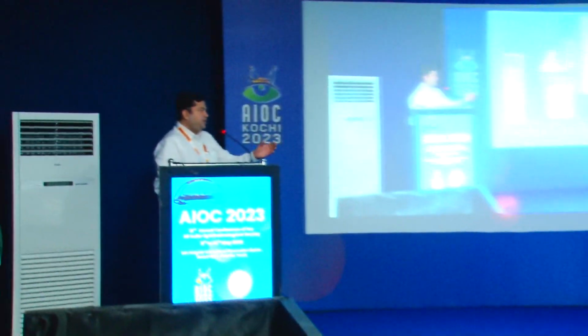For a non-vascular SHRM, it is important to identify whether it is a fibrosis, an exudate, a vitelliform lesion, or hemorrhage. This is based on the OCT, but the clinical scenario also matters, and the past history of the patient, like what Dr. Mohit showed. If you have had multiple injections, sometimes the fibrotic component can regress. So it can either be observed closely, or followed up, and OCTA may help.